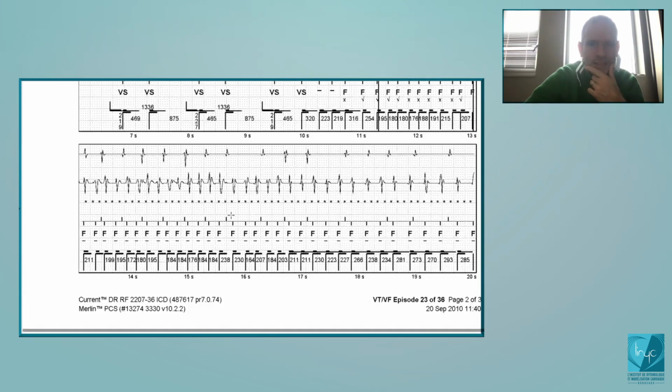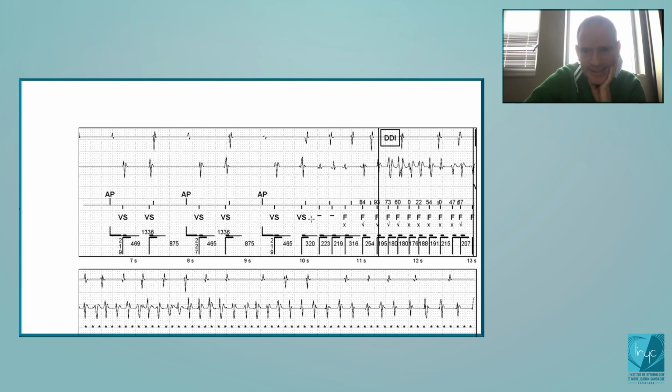So if I summarize, these parameters are very, very important, and I will explain why to program. And the major thing to understand is that for Abbott ICDs, you will always compare the current interval with the average value of the 4 previous cycles. Okay?